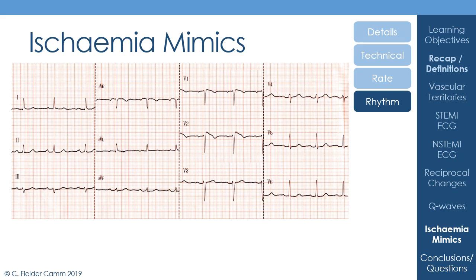We've got a P wave preceding each QRS complex, and the P wave is positive in lead 2. Cardiac axis is normal. The QRS complex is positive in leads 1 and 2. The P wave morphology appears to be all right. I think some of you might have picked up there appears to be a slight bifid character to the P wave in lead 2. Appears to be a couple of humps to it, but actually it's not that wide, and I don't think that this is P mitrale. Because although it has a slightly unusual characteristic, it doesn't look big.